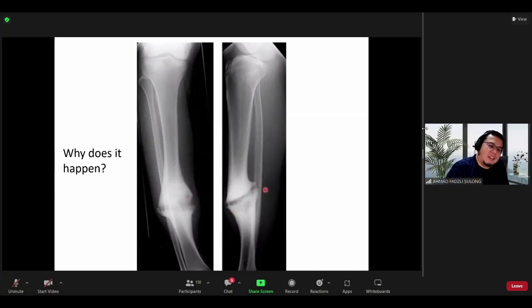Okay. So this one tak nampak ada bridging callus. This one tak nampak ada bridging callus. This one memang langsung tak ada because ada lekuk lagi. This one maybe ada atau tak ada tapi dimaafkan kalau kau rasa ada. Okay. Mungkin ada. However, kalau this one ada pun it's just one cortex, right? So it's definitely not united yet. So you need 3 out of 4 cortices here ada bridging callus baru kau kata it is united. This is a type of aseptic non-union and it is a type of hypertrophic non-union. Okay? Pernah dengar hypertrophic non-union?